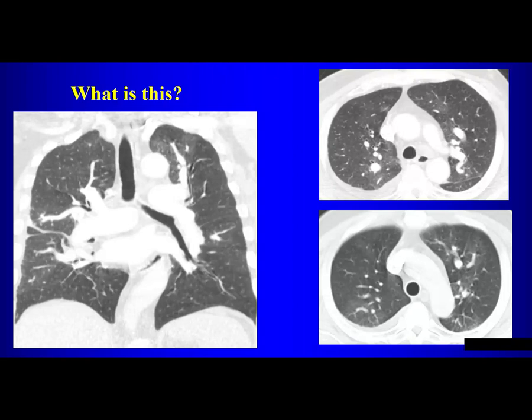Well, I don't see any. You don't see any what? I'm looking for chronic pulmonary embolism. You're not going to see it on the lung windows, right? Exactly. Well, what will you see on the lung windows? I can't say it's that, but the vessels are large. Like, the arteries are very large.